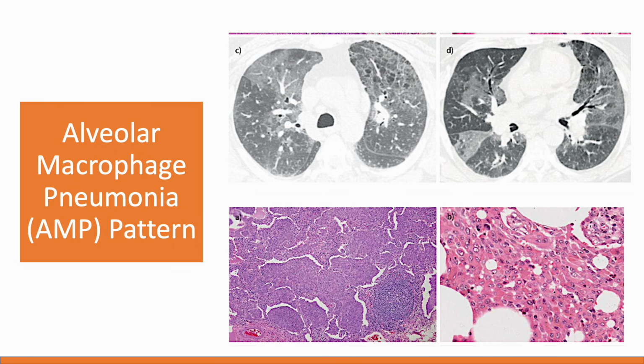When you look at the CT scan, you see patchy areas of ground glass attenuation in both lungs. And this comes in a background of paraseptal and centrilobular emphysema. You also see cysts that are scattered, like here in the left upper lobe. Now, alveolar macrophage pneumonia will commonly present as patchy ground glass on chest CT scan. And this ground glass, how do we differentiate it from RBILD?